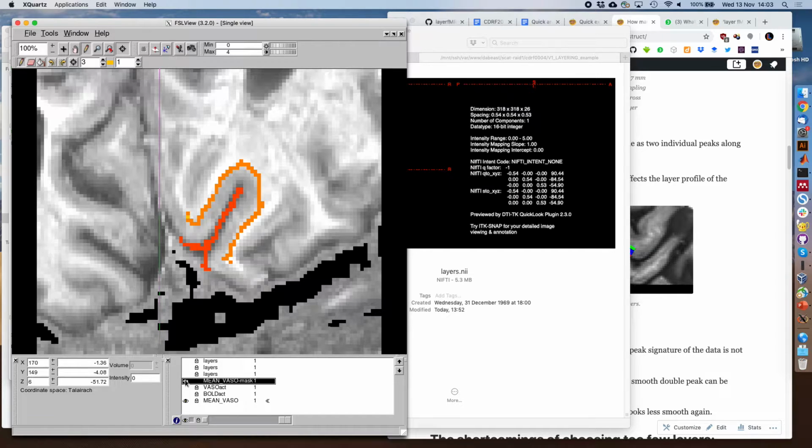I don't have an answer. Yeah, I think upsampling never really hurts. Of course, it depends on your statistical analysis at the end. For example, Camille earlier said that you can do divisions between different contrasts, like contrast response A divided by contrast response B. And there, your issue is a huge problem, because if you have a voxel that's only half filled with information, then you're dividing by a small number, and your ratio might explode. So it depends.